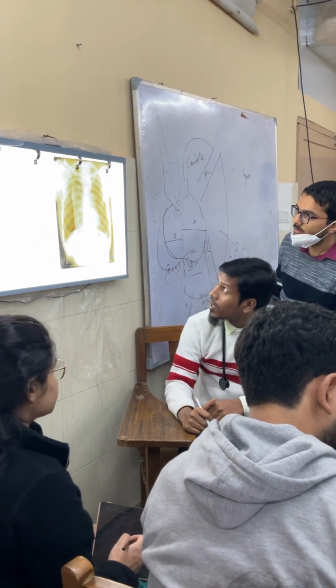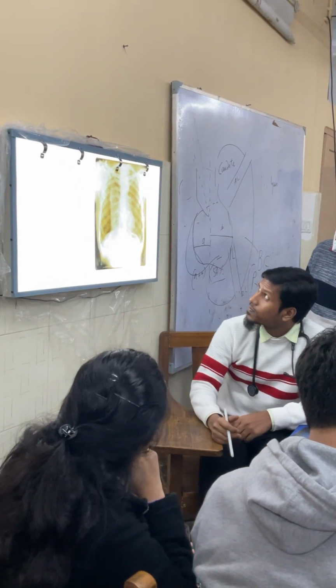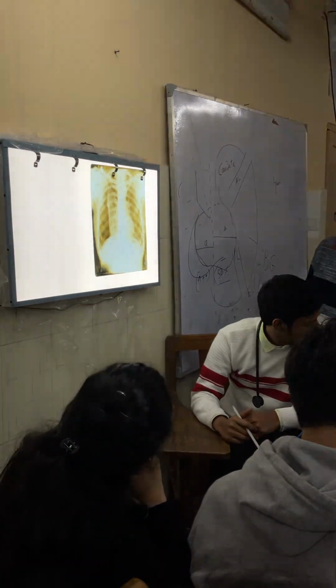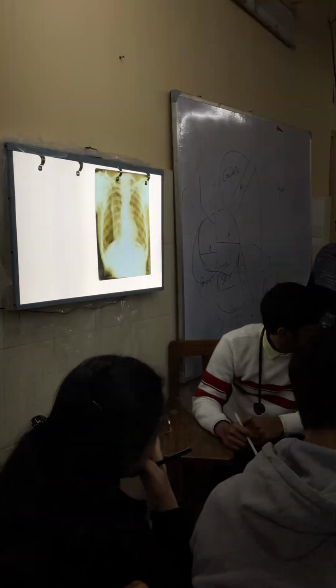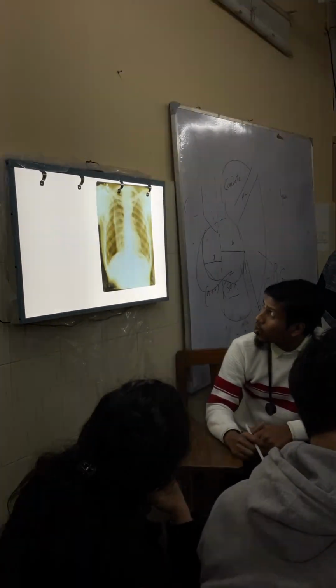Taken the midline, trachea central, bones no rib crowding, no rib covering, heart normal, normal heart contour.